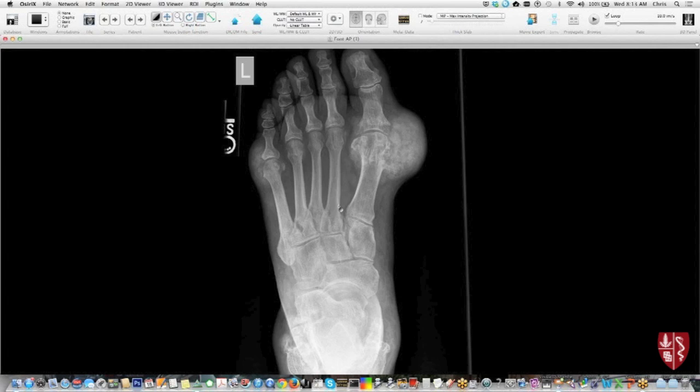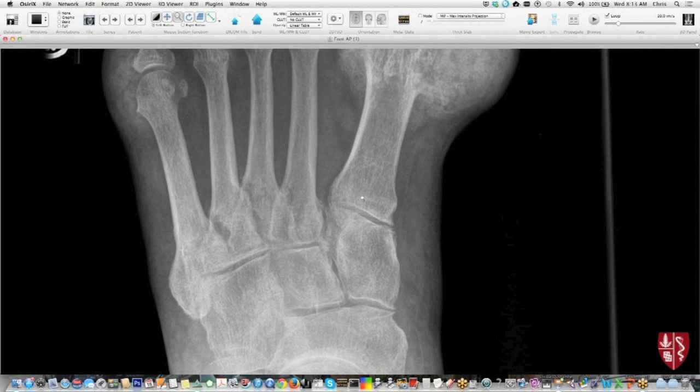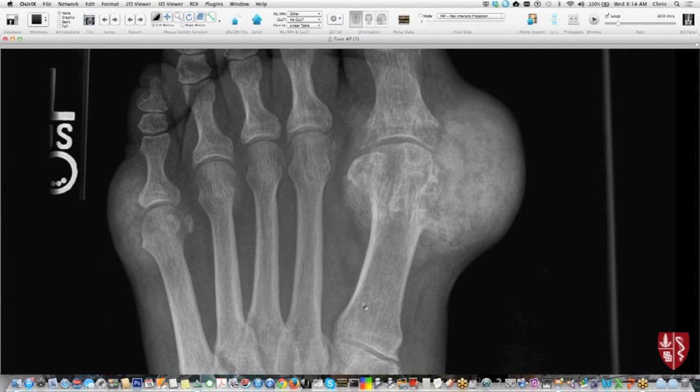One more example of gout. This is the classic podagra thing, right? As Dr. Jeffrey would say, this is like the state fair champ of gout. But this patient has a huge mass. They came in with a complaint that their shoes no longer fit or something obvious like that. That's a joke. Big soft tissue mass here, erosive change there, a lot of irregularity.